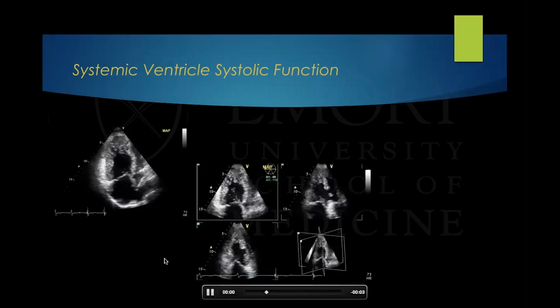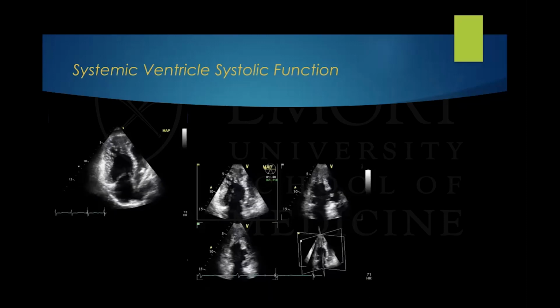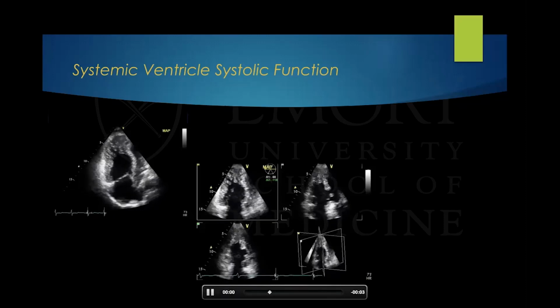So we try to add more information than just an apical 4-chamber view. Here you see that there is a triplane image of this right ventricle. So we can see the ventricle in the 4-chamber, in the inlet outlet view or the 3-chamber view, and the 2-chamber view of the same ventricle. Here you can appreciate that there is no continuity between the tricuspid valve and this aorta. This is the conal septum here.